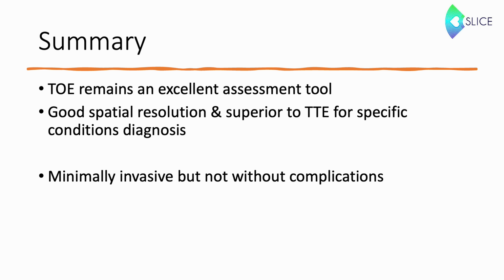In summary, transoesophageal echocardiography remains an excellent tool for cardiac and hemodynamic assessment. It provides superior spatial resolution and is diagnostically better than TTE for specific conditions. However, it is invasive and not without potential complications.